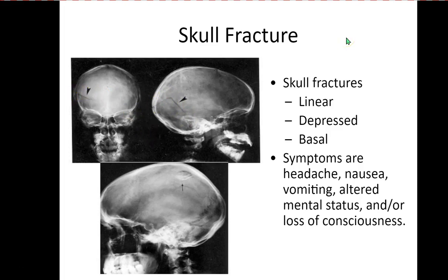Next, we have a depressed skull fracture. And a depressed skull fracture occurs when a fragment of bone has been separated and depressed into the cranial cavity. And that is what you see here. Sometimes these depressed skull fractures are called ping pong fractures.